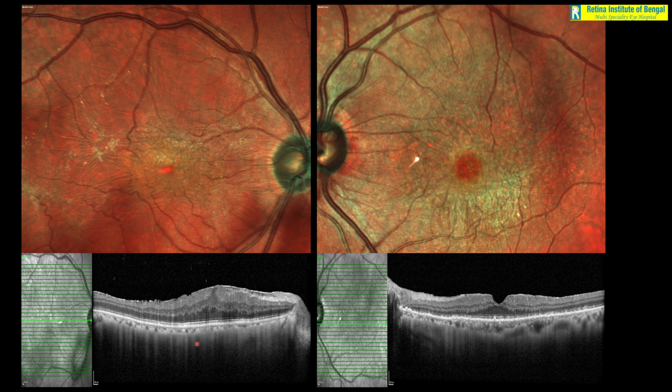For example, in the patient on the left hand side, you can clearly see that the fovea is disturbed by the contractions or the effect of the epiretinal membrane on the retina. But for the patient on the right hand side, you can see the epiretinal membrane is circumferential. It is surrounding the fovea but not actually affecting the foveal pit. Again, something that is confirmed by the OCT. But if you had not even looked at the OCT, just by looking at these multicolor images, you could have made out the same.